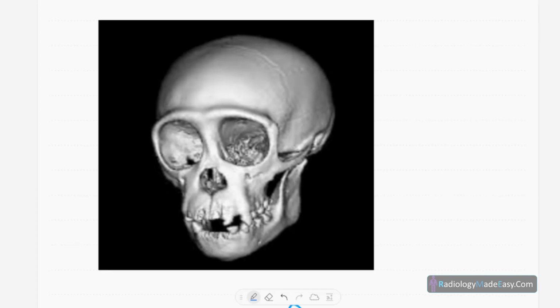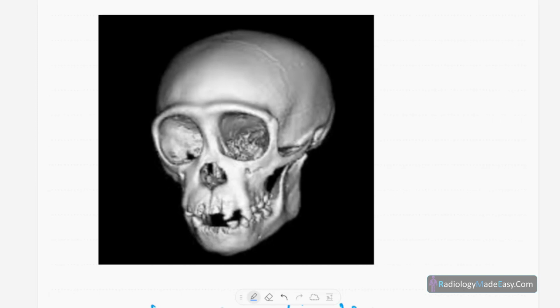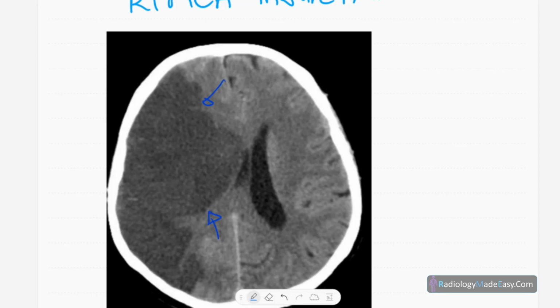This is an infarct. You can see low attenuation in the right MCA territory, or right middle cerebral artery territory. You can see a well defined low attenuation area. It has mass effect and edema, that's why there's midline shift. This is low attenuation compared to normal brain parenchyma here. So it's an MCA infarction. The margins are clearly seen.